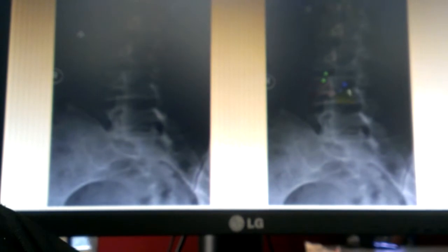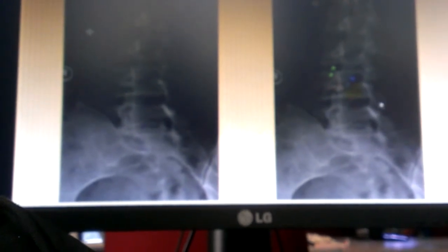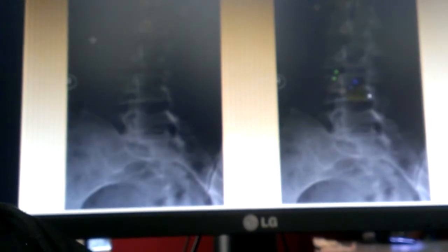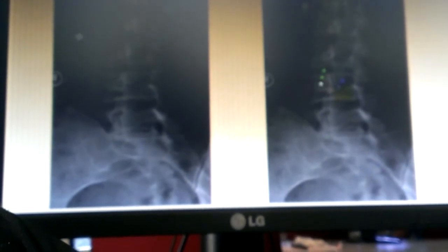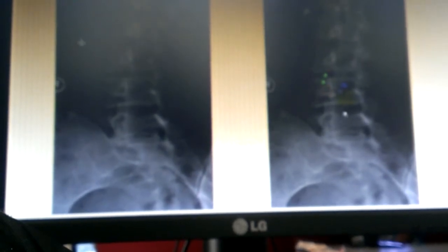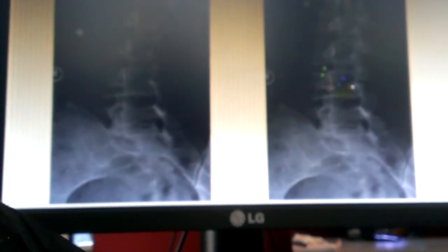Okay, so here we are again. Here's the body of our Scotty dog. That's the lamina. This area here behind the body, which is the spinous and the inferior and superior process, and the tail and the back, you don't worry about because you're going to shoot the other oblique. You always shoot a right, you always shoot a left. And then, of course, the nose of our dog is the transverse process, the ear of our dog, superior articular process, the foreleg or the front leg is the inferior articular process, and then if our dog has a collar, we say that they've got spondylolysis.